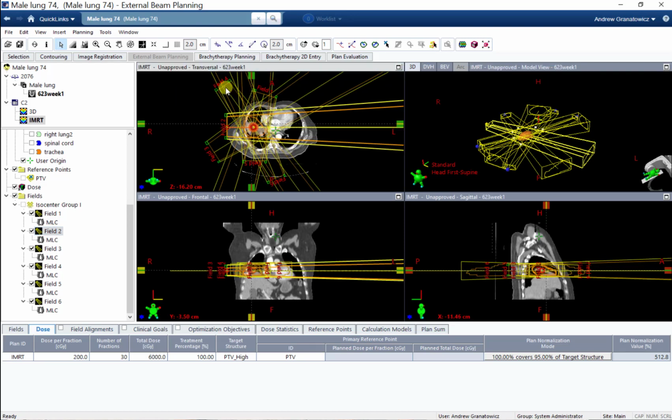Now let's get into an IMRT plan. So when I'm choosing my angles and things like that, I'm thinking of the same things as when I'm doing my 3D plans, in terms of collimator angles. What directions do I want my MLCs to come from? What do I think is going to be easier on the optimizer in order to block out certain OARs or get good coverage or get more conformal on my PTV, things like that. So you can definitely have a different collimator angle on each beam. In this case, I'm just leaving it at 0, but definitely look at that.